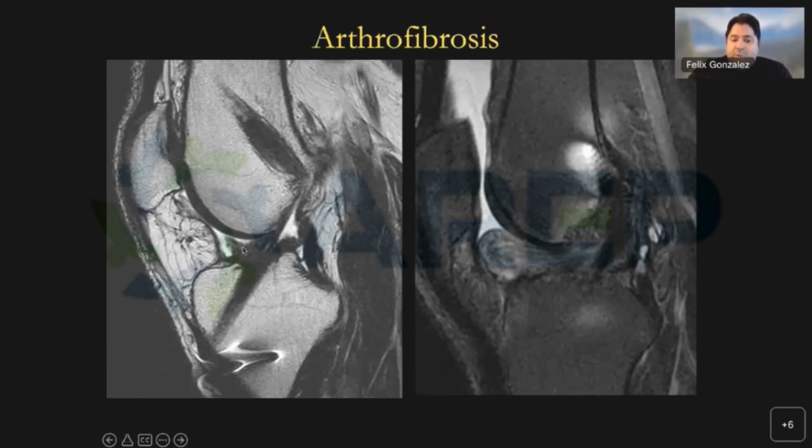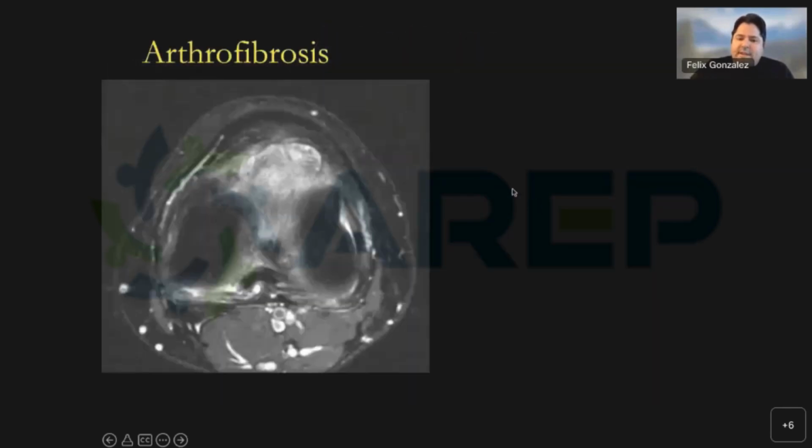This is an example of a smaller lesion, very tiny here, and this is another knee that's showing a very large cyclops lesion anterior to the ACL. One thing I have to say is there's literature out there that says the cyclops lesion has usually been described after ACL graft repair. However, it can be a result of a partial ACL tear. You can have a partial ACL tear by itself with a cyclops lesion. It's not unique to the post ACL graft reconstruction state, basically.